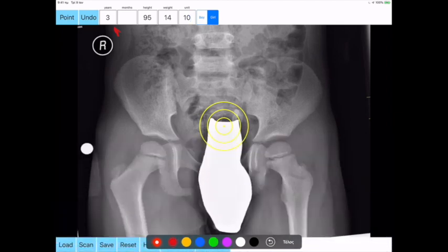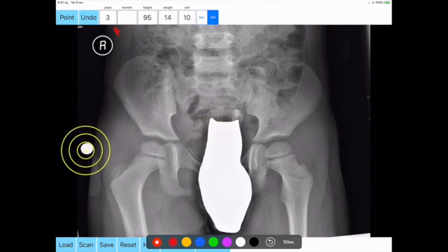Next a dynamic circle appears with a C1 center point marked over the screen. The radius of the circle is changed dynamically and by moving the attached finger you try to find the best fit circle to the contour of the coin. Once you found the best fit you press the point button and the subject, whole coin, is marked by the circle and the radius point, R2, appears. If the coin for example is 10 mm you enter the number 10 in the unit box.